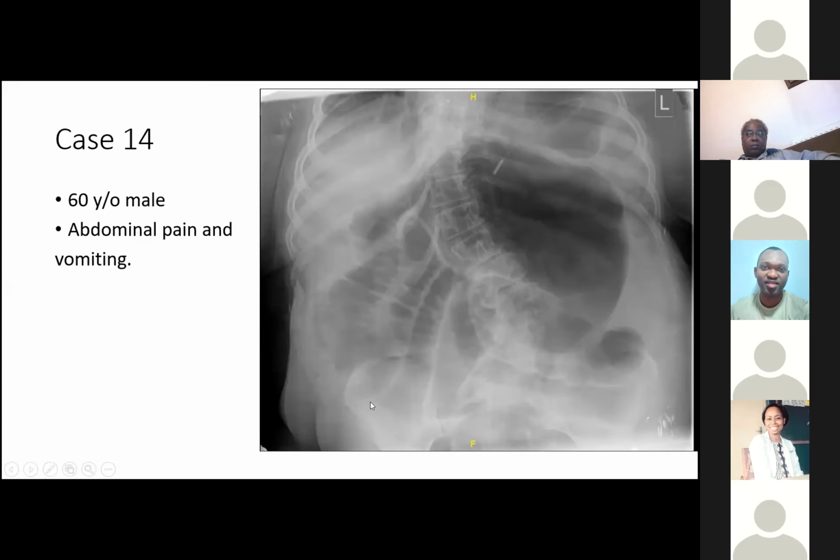So it's the absence of normally sited large bowel in the right iliac fossa and the right flank. By looking at it alone, there's nothing that says it's definitely cecum, apart from the fact that you can't see a normal cecum, and small bowel distension, and by elimination, it doesn't look like sigmoid colon.